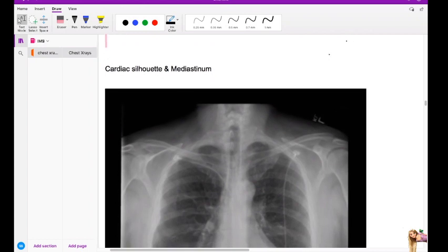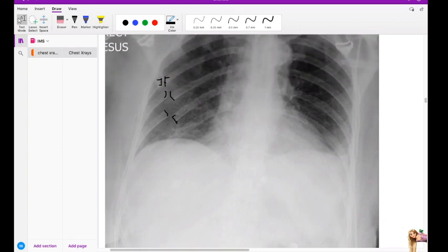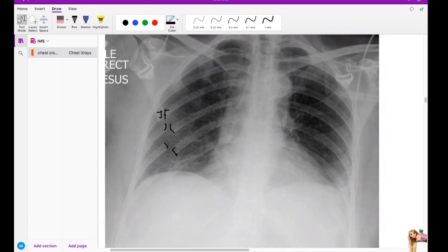So next, are you sure this is flail? I think so. That was the diagnosis when I chose it. Why do you not think this is flail though? You have both sides. How could I not? It's there. It's very subtle, but it's there. Let me show you.